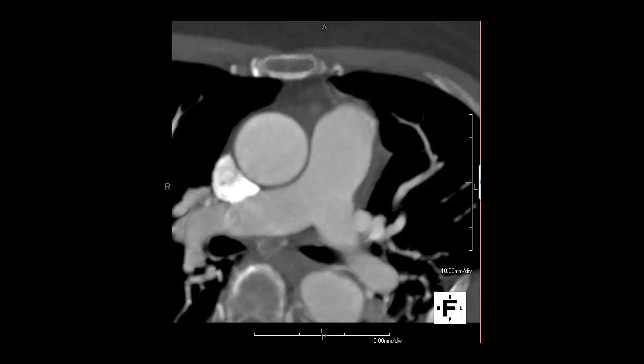This is case L3 Ct A59. The case history is that of a 56-year-old woman who has had recent episodes of severe chest and abdominal pain. We begin with general inspection of the study.